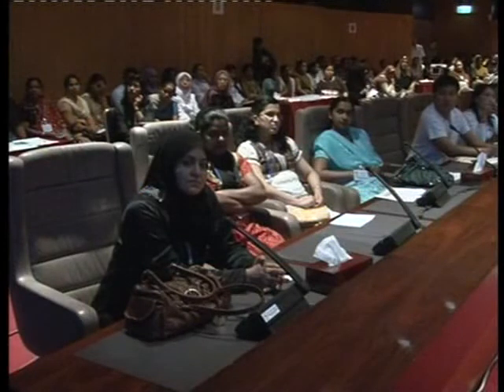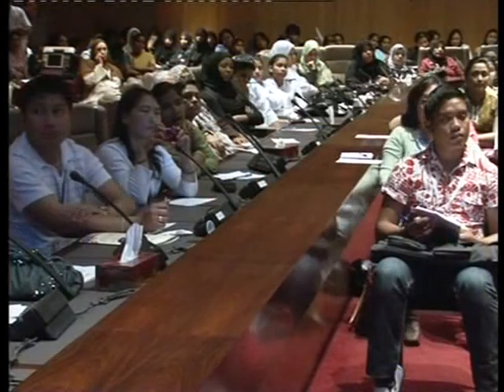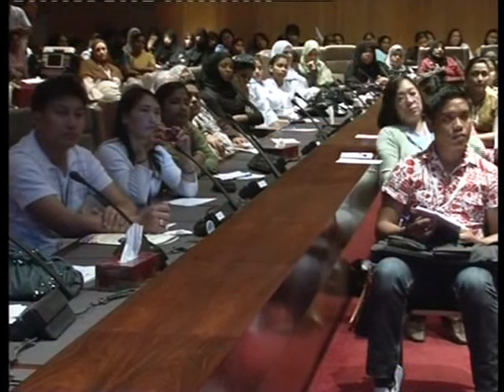So we have here this pacing, and here we have this intrinsic. Here we have complex number 1 and complex number 4, which are normal intrinsic beats. And you see here complex number 2 and 3, and the last one here is a pseudo fusion beat. And number 5 here is a complex of pacing, contractility, and depolarization. So in order to distinguish this, I will come to the questions. When we look and find an ECG like this, this patient has an intrinsic rate, and is sometimes not captured due to the pseudo fusion beat, and sometimes captured.